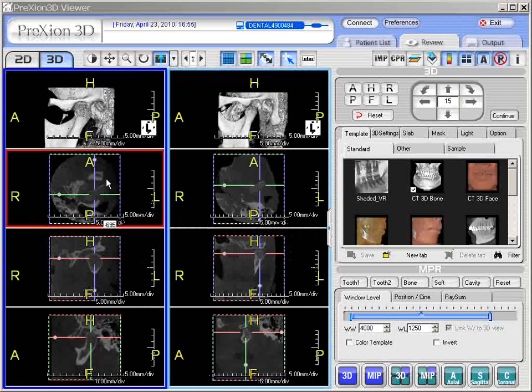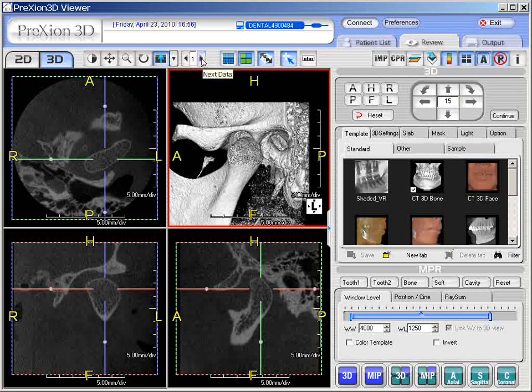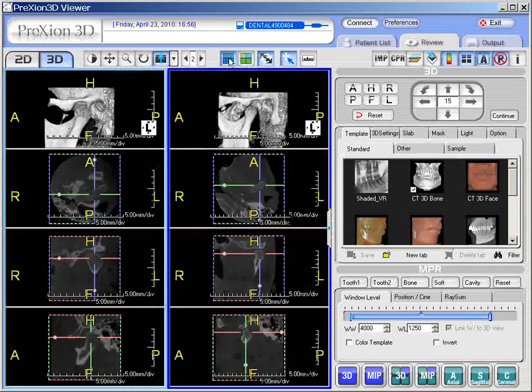One has the ability to simply load up one study as you would normally see it. To do that, you can simply come to this icon that says Display One Series. So if we click it, we've got the Display One, which is the closed portion of the TMJ. So we're looking at the TMJ in the closed position. We can simply click the next arrow over for the opened, and we have now the open position for the TMJ, axial, coronal, and sagittal. To go back to the multi-series or display all series, click this icon, and you'll get back to the side-by-side format that we originally started with.